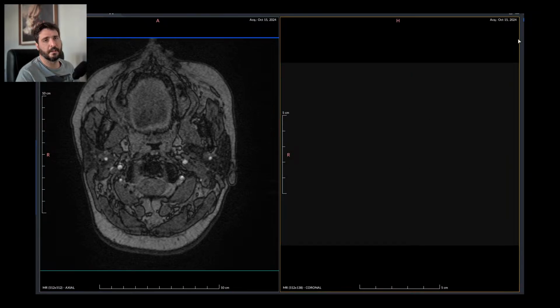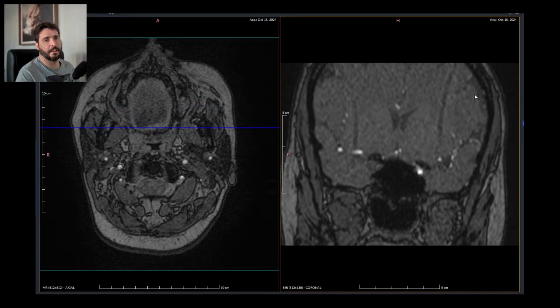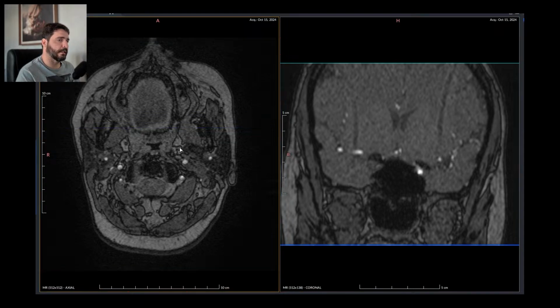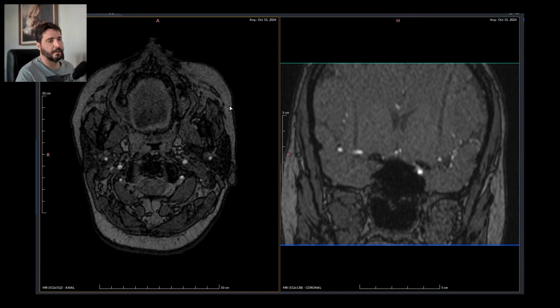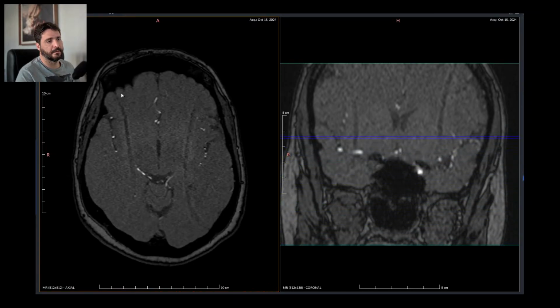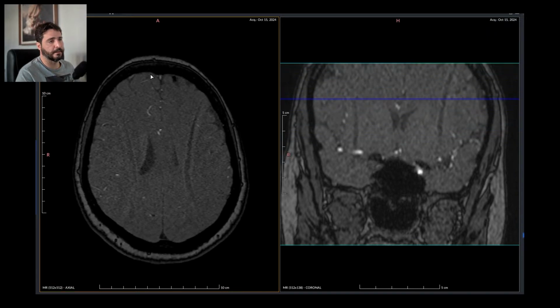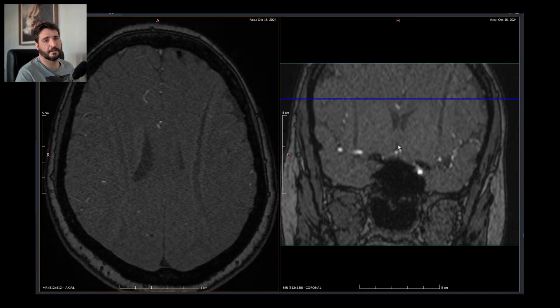Let's do ourselves a favor. It's all shaky and it has bilateral double artifacts, which means the technician can't do a proper setup of the sequence, so he did it wrongly and distorted the entire image. Of course, let's report it anyway because reasons.